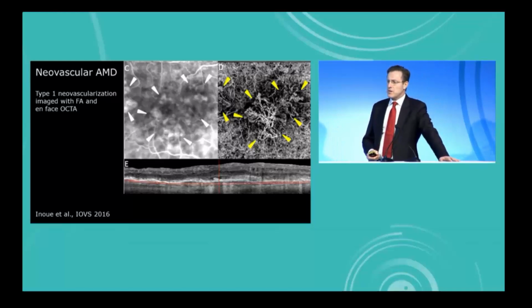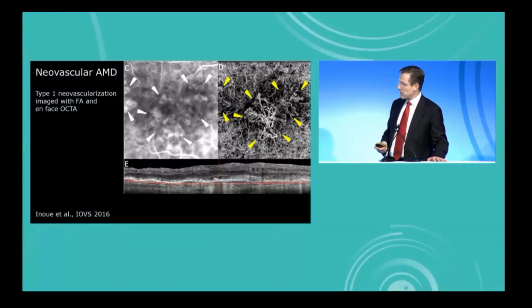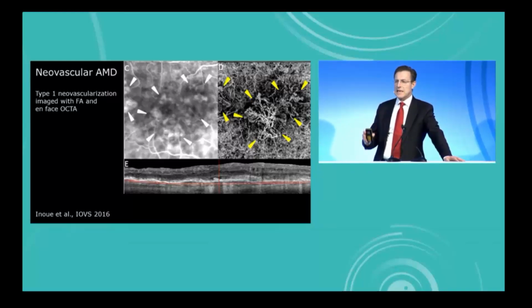And this is where currently there may be a need for you to step in and manually trace where you, with your brain pattern recognition system, can identify the remains of a pigment epithelium layer. And this means that there is a lot of interaction here, and I can assure you that the people who pioneered this technique and who have described all the essential features, they have done OCT themselves.